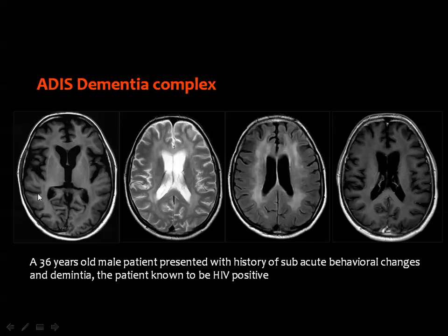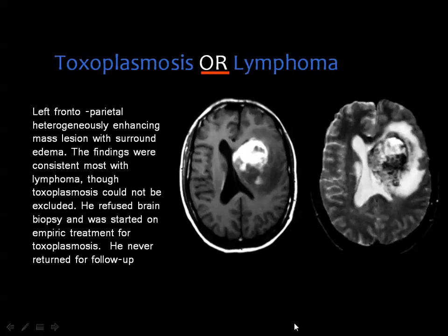And you can see this brain for a patient 36 years old, which you can see this appearance in patient over 60, for example, with dilated ventricles, dilated extraaxial CSF spaces, sheets of abnormal white matter signal around the ventricles due to ischemic changes or due to the effect of the virus on the vessels or the white matter. And after you inject contrast media, you got no enhancement.